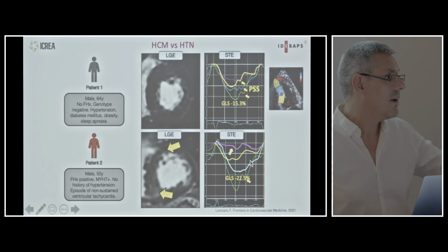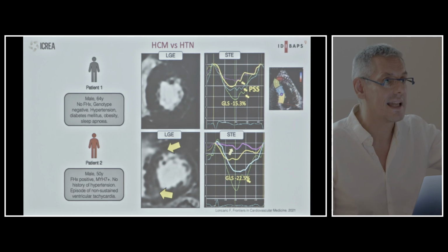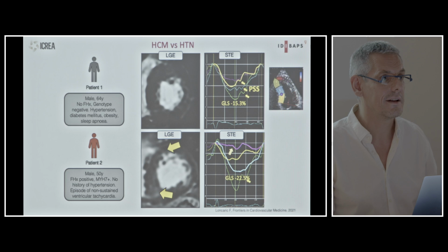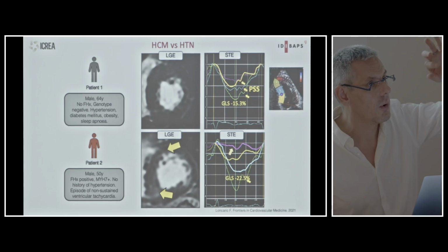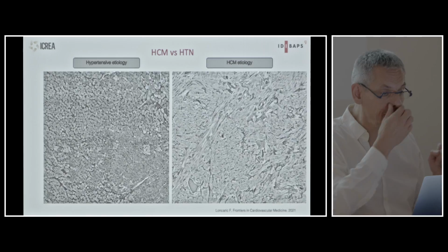So you see here in areas, and they can vary in patient, that can be anywhere in, as we said before, the septum, it can have any extent, depending on the patient, but what you see is relatively normal strain patterns, very abnormal, relatively normal, that is very typical HCM. When you go from a gradient where the basal part is reduced with post-systolic, and then you go to normalizing, that is very typical hypertension. And the reason for that is actually this.